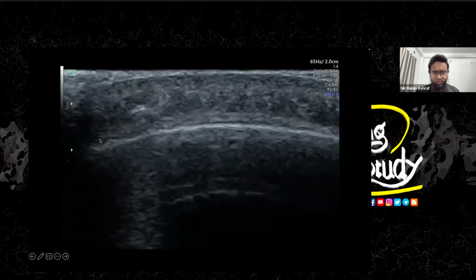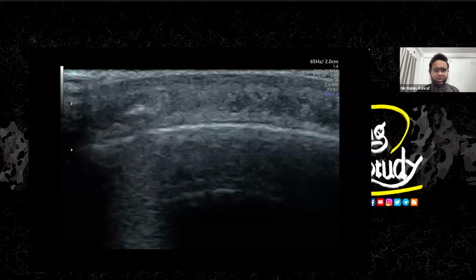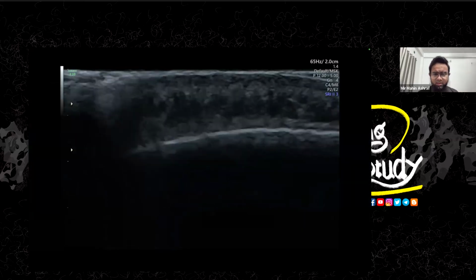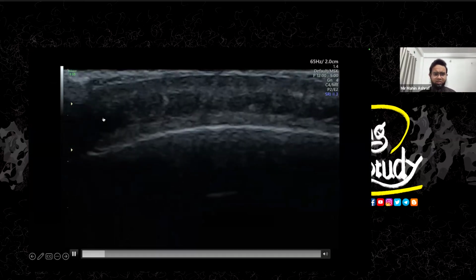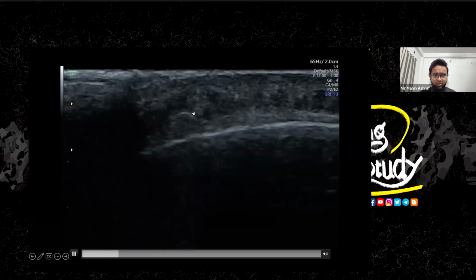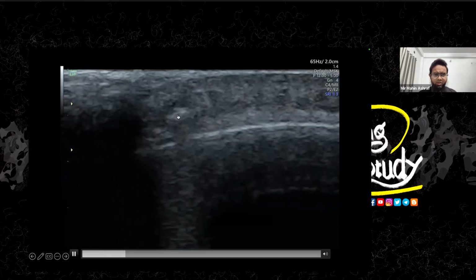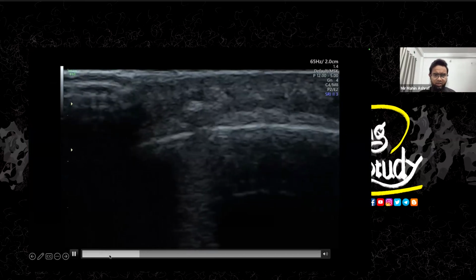It was located, I think this is the picture of the thigh region actually. Okay, so here is the scalp of the patient, and over the scalp you can see this is the skin, and I think I have seen that structure. This is the area of the pellet. You can see this irregular something located here.